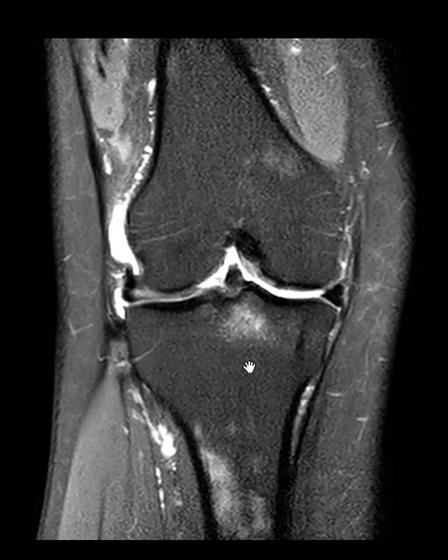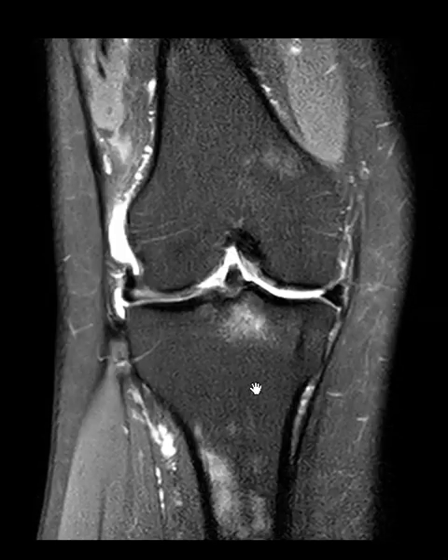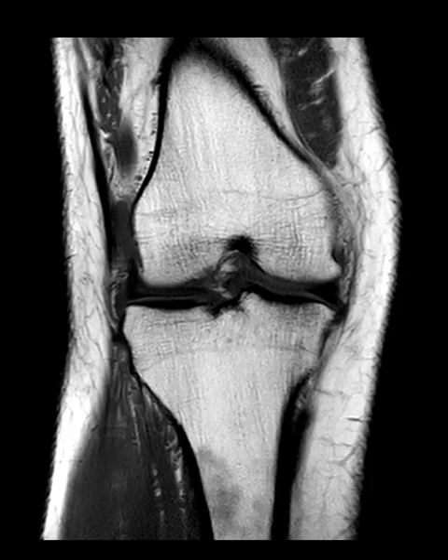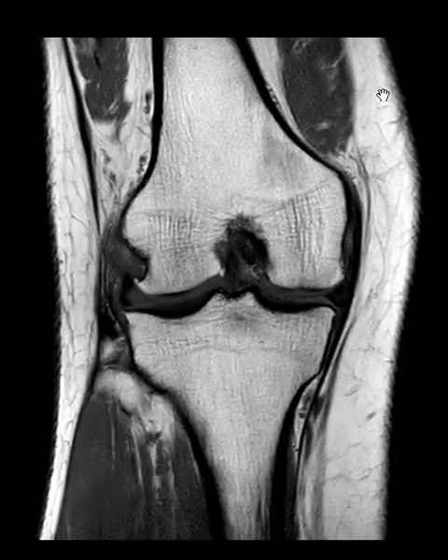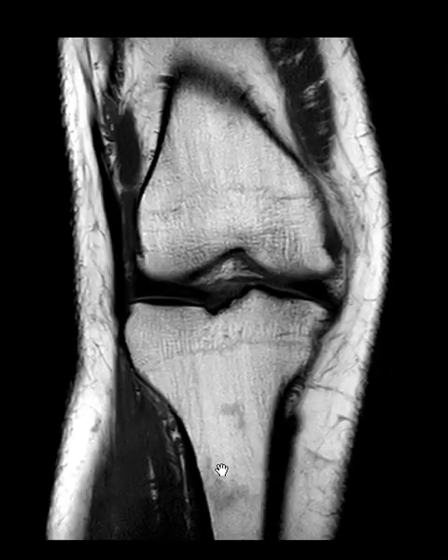This is a fat suppressed sequence, so just like the fat in the subcutaneous soft tissues, this is low in signal, the fat throughout the marrow space should be low in signal. So this is bright. So we call this red marrow reconversion. It's converting from the fatty marrow back to active red marrow. We can see the same thing on this. This is a scan where fatty marrow will be bright. So the subcutaneous fat is bright, the fatty marrow is bright, and over here it's not bright. This is the area that we're concerned about.